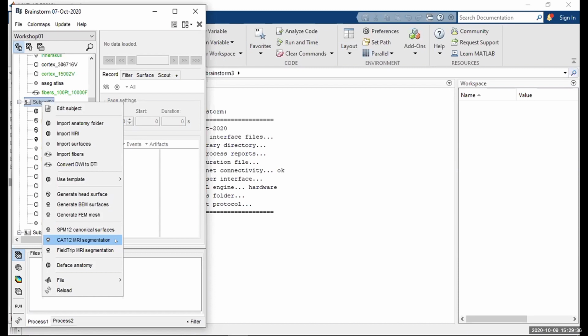And in that case, you can do your MRI segmentation in a pretty reasonable amount of time, straight from Brainstorm, essentially. So you don't need to run FreeSurfer overnight, install all the dependencies for an external software just to do this. For information, that's something that's available.